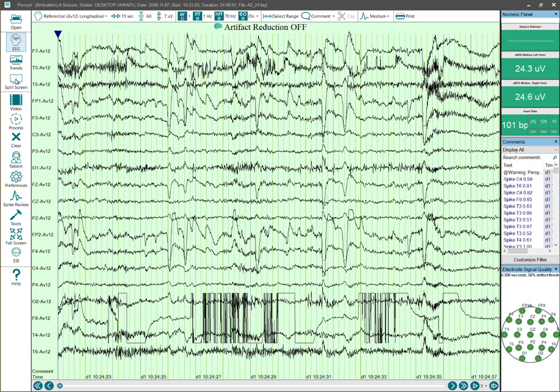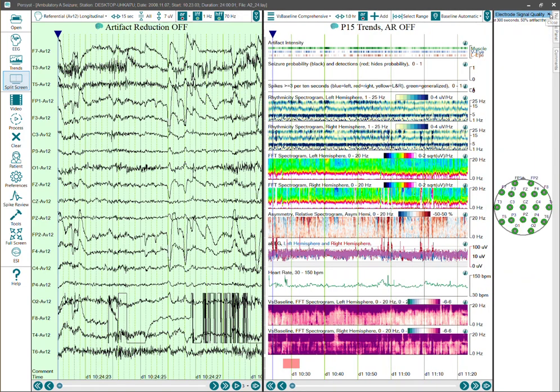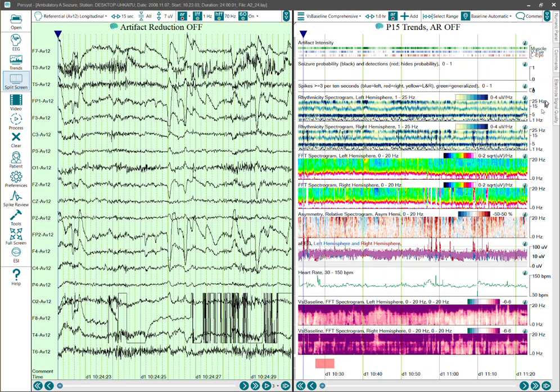And let's find some alpha. So to do that, I'm going to split the screen, and I'm going to move some of these boxes out of the way because they take up a little bit of space. But now they're just tabs. In a review, normally you'd have them tabbed out of the way if you weren't using them.